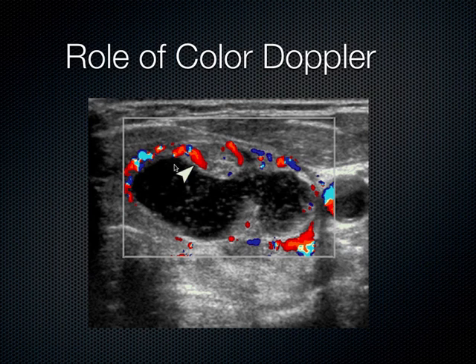But there is flow within that mural component outlined here by this arrowhead. We can see there's flow that does penetrate into that mural component, telling us that this is actually tissue and not something else like debris. Because sometimes it's hard to tell the difference whether something's really parenchymal tissue versus something that is just sort of artifact, debris, hematoma, what have you.